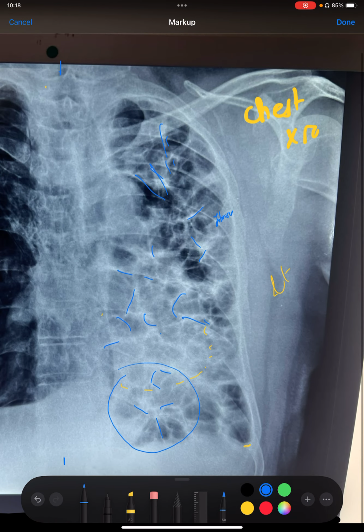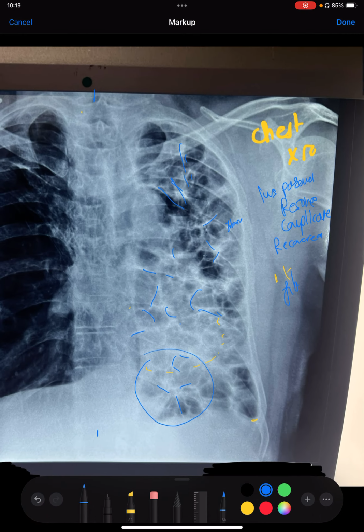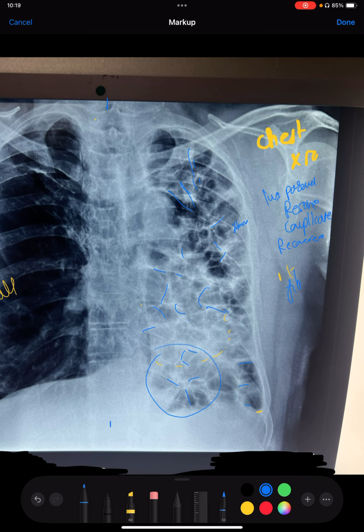There is all fibrosis. Fibrosis indicates a lung parenchyma damage that is not resolved, that is actually complicated by fibrosis. Anytime when the lung gets damaged, it should completely recover to its original size, shape, consistency, and integrity, or if it gets complicated, it will go in favor of fibrosis. Now, as we can see, there are so many dense white fibrotic structures or fibrotic lines spread all over the left lung parenchyma.